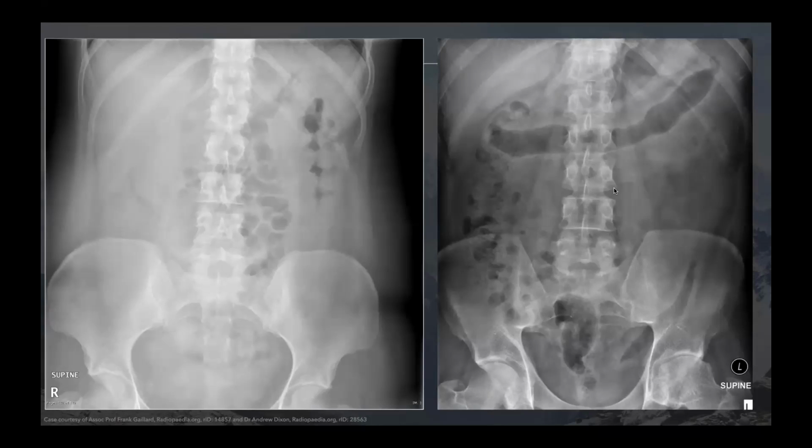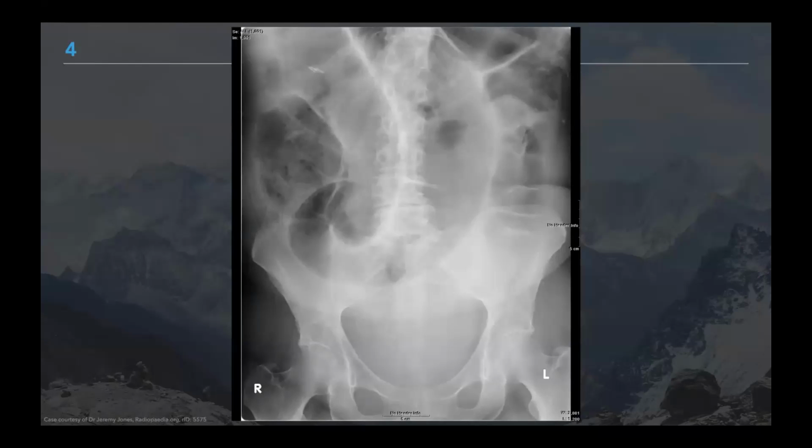So if you were a really excellent candidate, you would describe this as evidence of chronic inflammation, most likely IBD. Supporting evidence is that the patient has fused SI joints. Cool. Okay. So this is a special type of large bowel obstruction. And this is one that you should eyeball and just know the diagnosis immediately. You can see there's this absolutely gigantic loop of large bowel with haustral folds, occupying almost the entirety of the abdomen. And there are some additional smaller loops of dilated large bowel elsewhere.